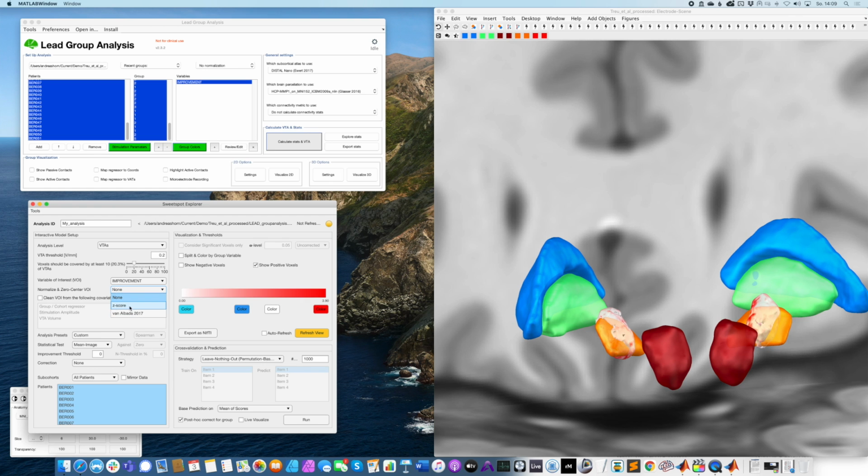And there are two options. One is the simple z-scoring, and the other one is a normalization, a Gaussianization based on a method by Sascha van Albada in 2017, which is, I think, a genius method to transform any random variable to a Gaussian variable. If you use that, look at the paper, right? So that is not something one should add in carelessly. But let's assume we have Parkinsonian patients and all of them cluster at something like a 70 to 80% improvement.